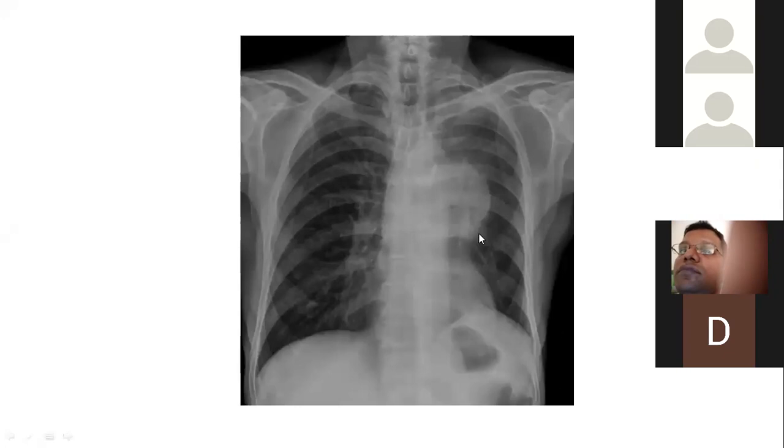So broad based or obtuse angles being formed here, right, on either side. So it gives you a hint that it is likely arising from the mediastinum. Though we already saw that this is not 100% true all the time, but definitely this is one of the more sensitive or more specific indicators on a plain radiograph.